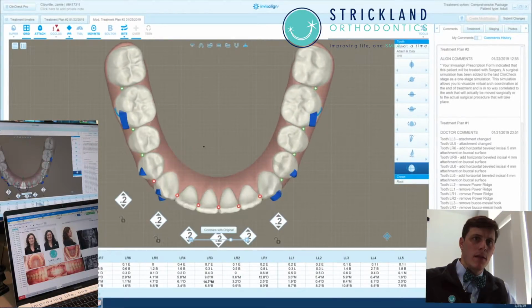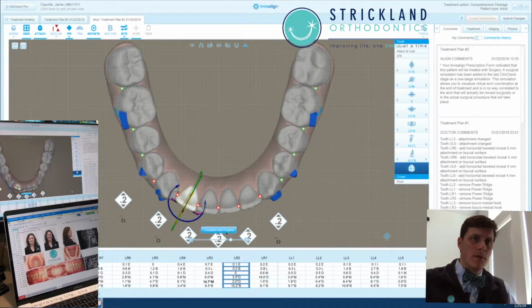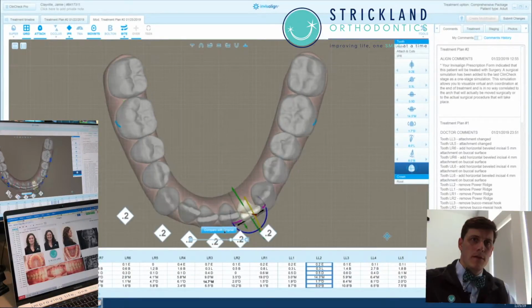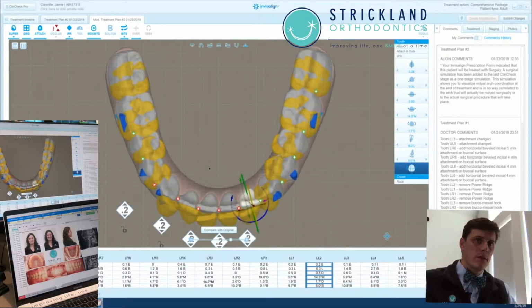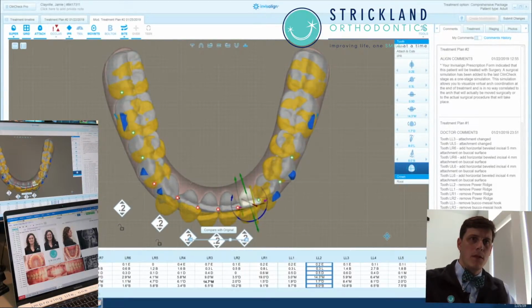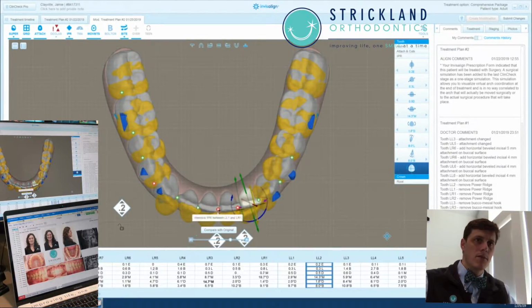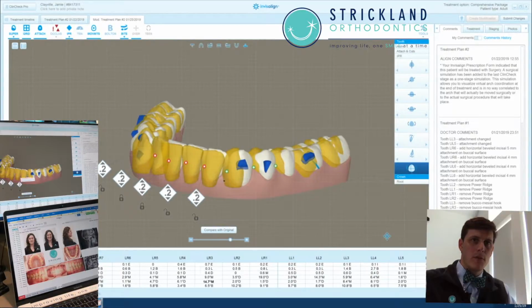And then there's a lot of aligner lag that happens, and so depending on the movement and what we're trying to do, the last stages are usually not straight. More the art of what we're doing goes into place. And this is where I am looking into seeing how much the surgical jump is planned. The canine, it's around 4 millimeters and about 3 millimeters at the incisor.